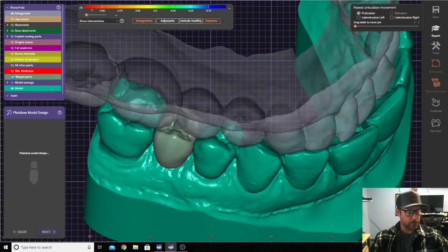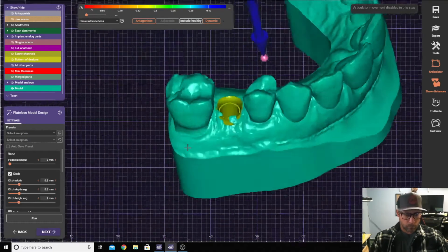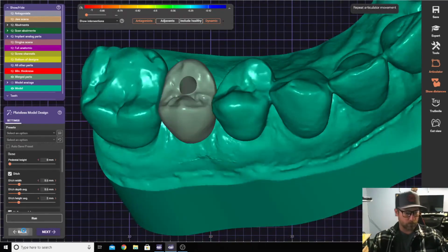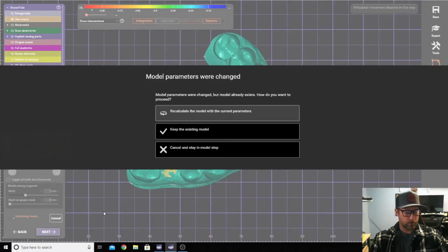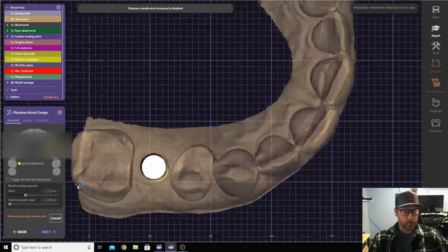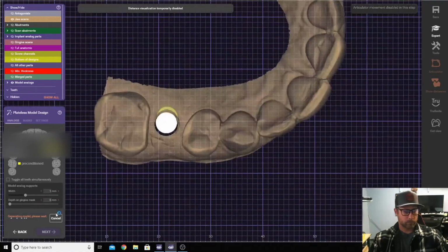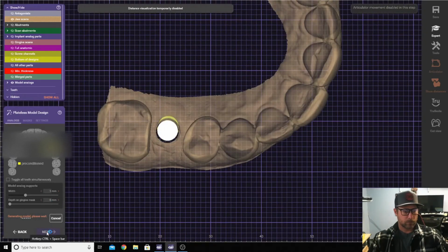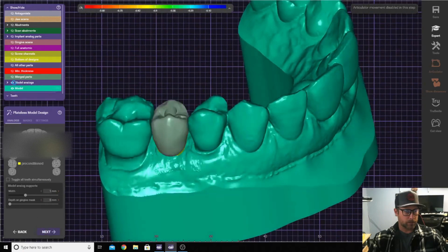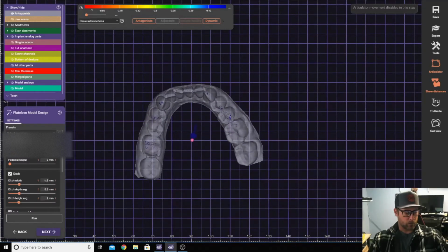Sometimes you'll get this flash right here. In order to get rid of that, you can go back and do preconditioned, recalculate, and then what it'll do is it'll just wipe all that stuff out. Any moment now. Okay, there we go. So basically it just uses my Emergence Profile that I created for the whole.